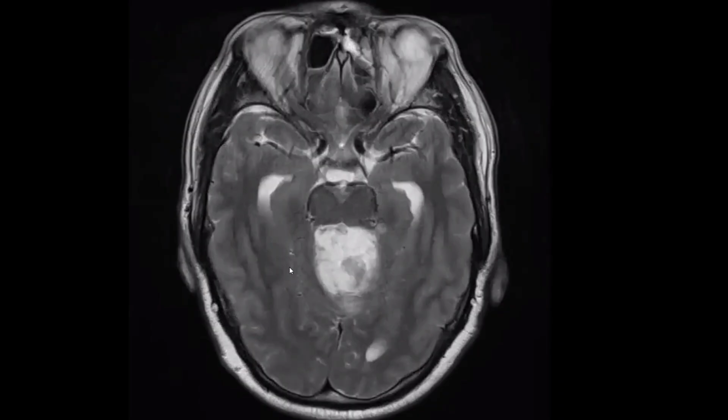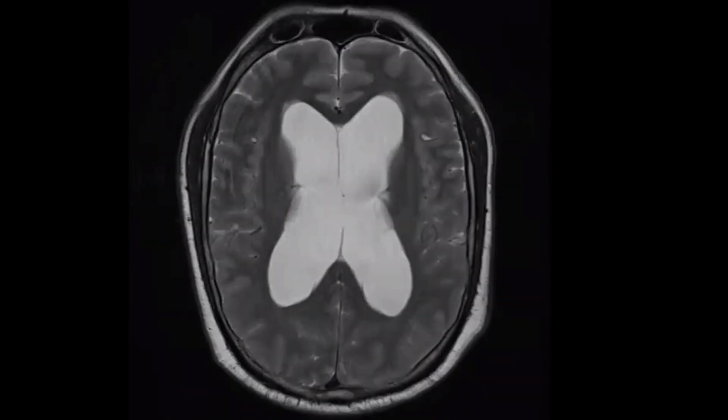causes. And as you said, we are suspecting epidermoid, and as we know, if we need to differentiate between epidermoid and arachnoid cyst, diffusion-weighted imaging is very important. My advice in this case for you in the exam: you may see a simple case or a simple diagnosis in a very rare location, as you see here. Epidermoid cyst is not commonly seen inside the fourth ventricle, but really well done. This is a straightforward case for epidermoid cyst. Thank you so much. Can we move to candidate number 5, please?